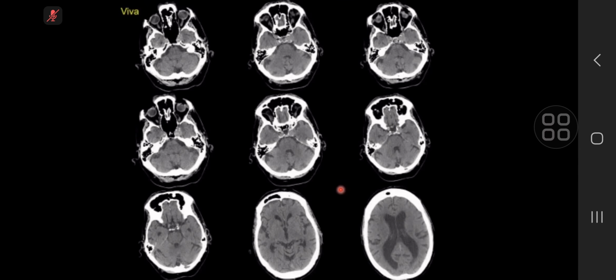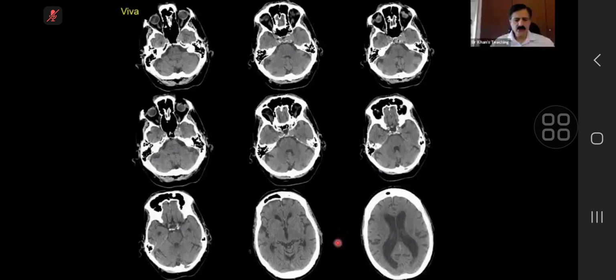So these are selected unenhanced CT images of the brain for an adult patient. I can see an abnormality in the left, I think internal carotid canal, where there is expansion secondary to a large mass. What will you like to do next?